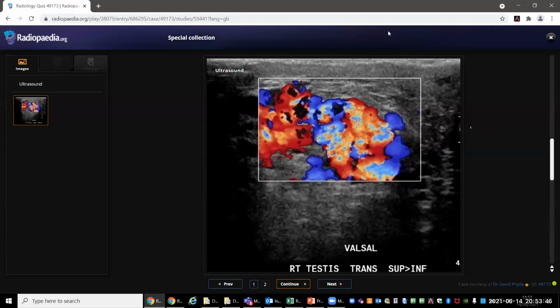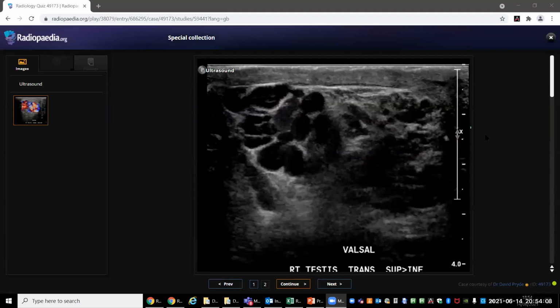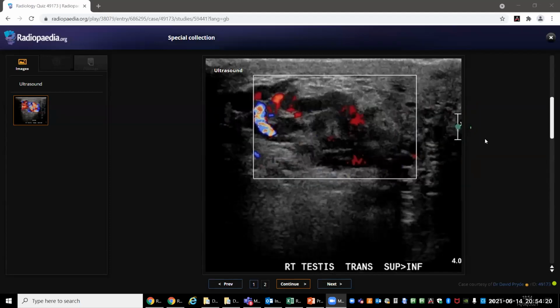Is there any specific history in this patient? I'm not giving you any history. So scroll through this. You'll see images, and then you tell me about it. So this is the first one. There's the second one. It is labeled, so no problem. So these are the three.